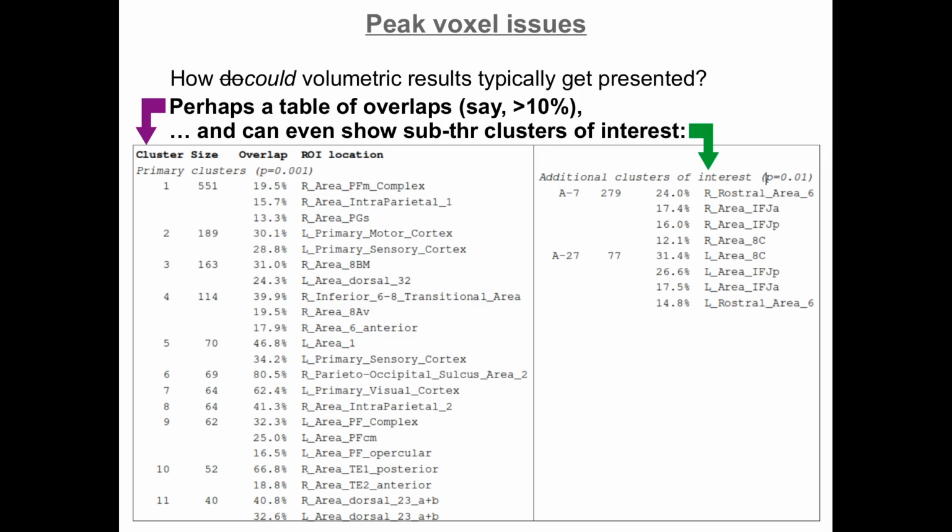So I would maybe come down to the idea of choosing your significant p-value and definitely reporting all the clusters here in this way. But then, we are researchers, we have other interesting information and background information that we know about. It might be possible to also choose clusters to report at a lower significance value because they have meaning to the study, because of knowledge from prior studies or whatever.